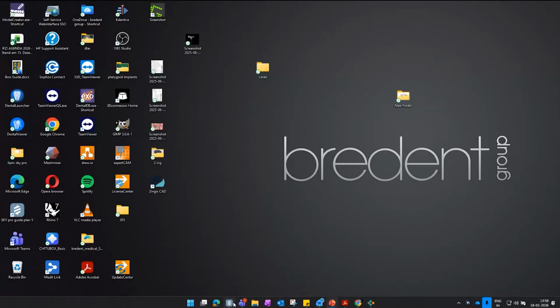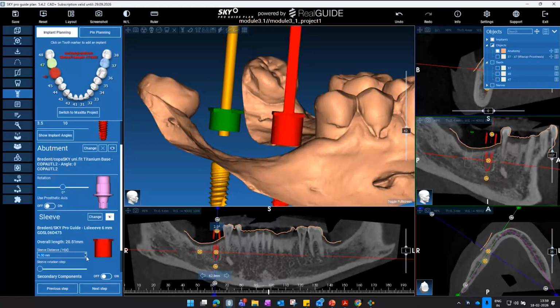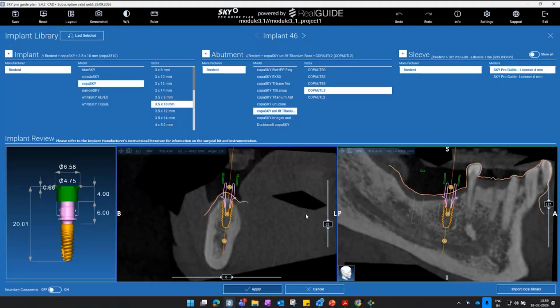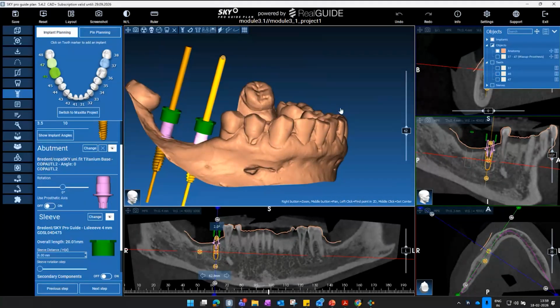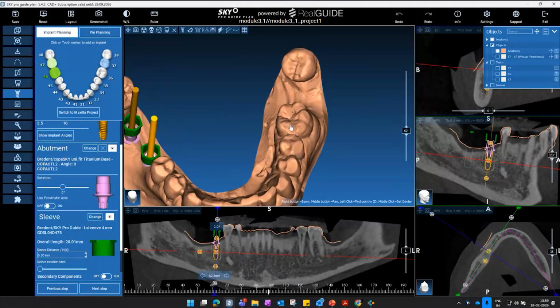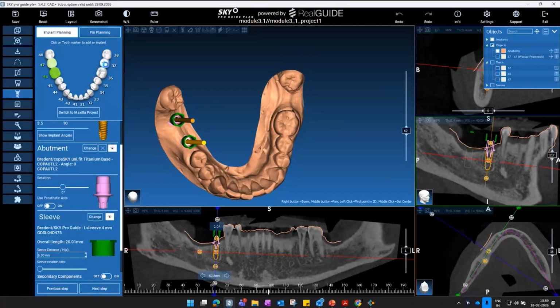So if you have understood sleeves, just checking if you have any questions here. Okay, so if you have understood sleeve, I will correct this. Change it to 4. So if you understood this, then I'll go to 3.7 now.